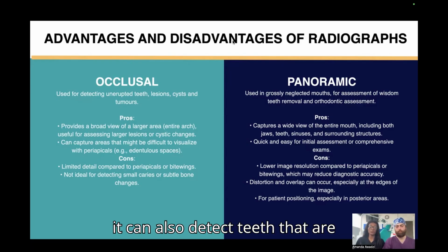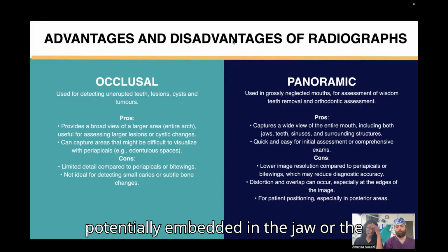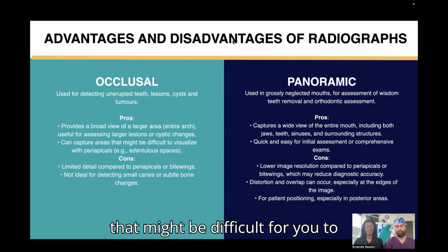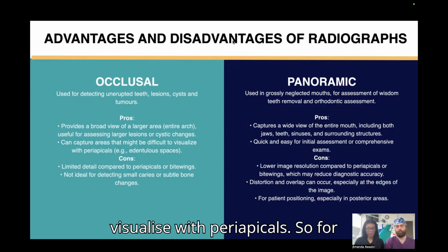In some cases, it can also detect teeth that are potentially embedded in the jaw or the maxilla, and it can also capture areas that might be difficult for you to visualize with periapicals.